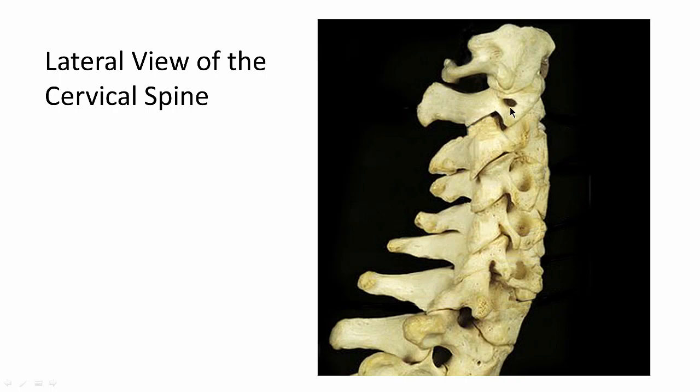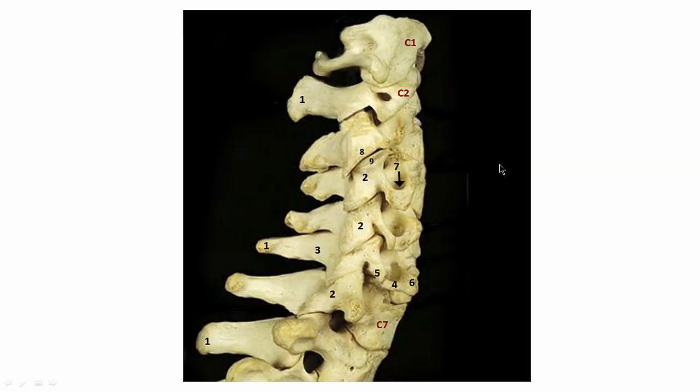All right, what else can you see? Transverse foramen would be right here. You have uncinate processes here. We'll look at those better from the A to P view. Okay, I think we're going to blow this up. Let's see. Nope, we're going right to it here.